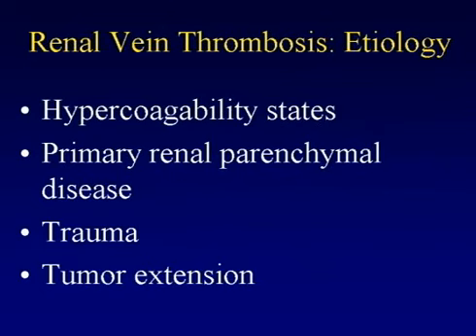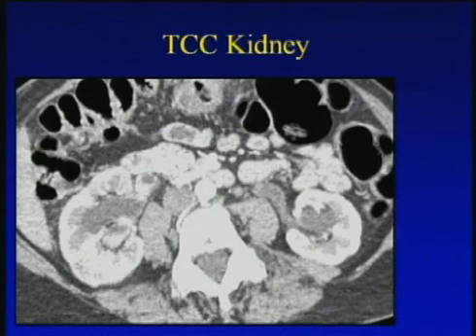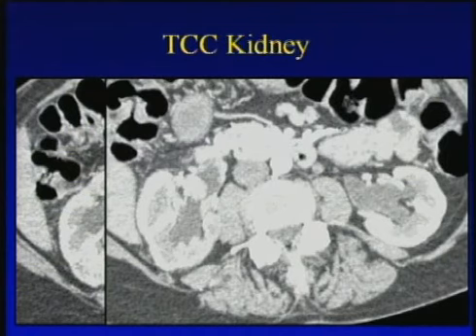And those changes are true regardless of the cause of the patient's renal vein thrombosis. Beyond arterial and venous, things that cause obstruction, whether it's stones, whether it's in this example where the patient has decreased, the right kidney is enlarged, the change in cortical medullary perfusion on the right side is very easy to define. And then the question is, why is it?